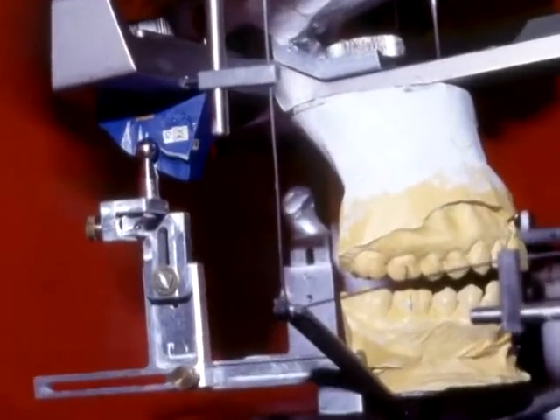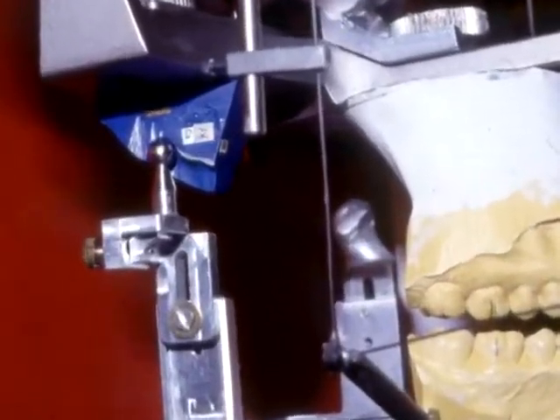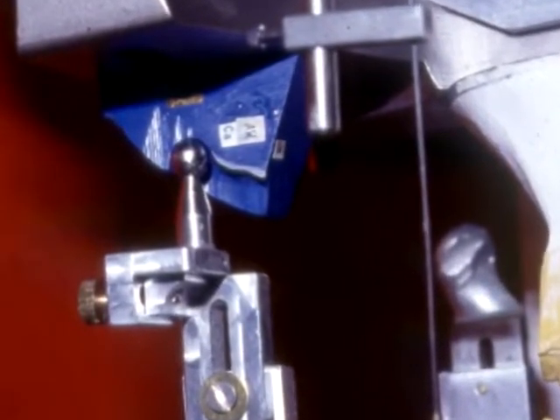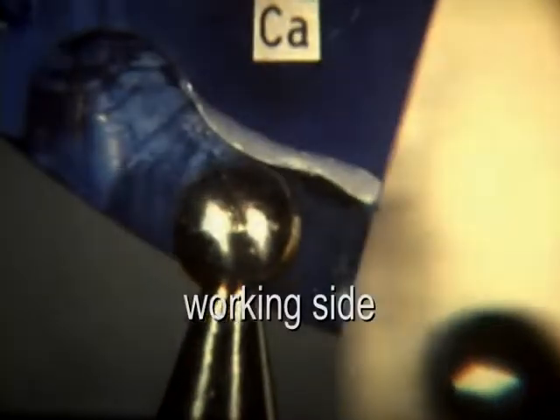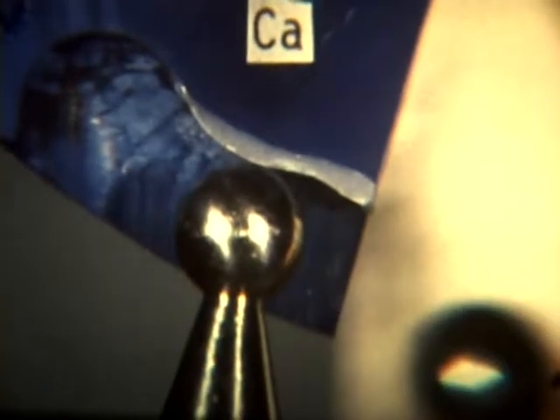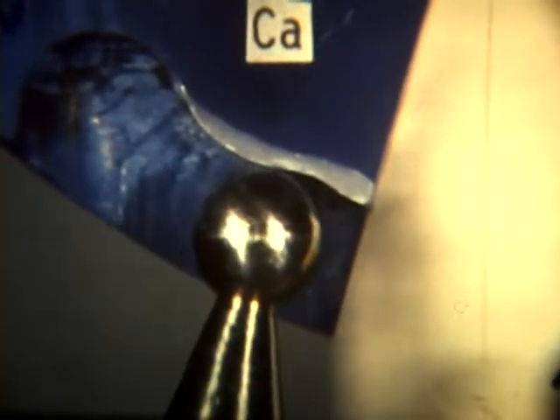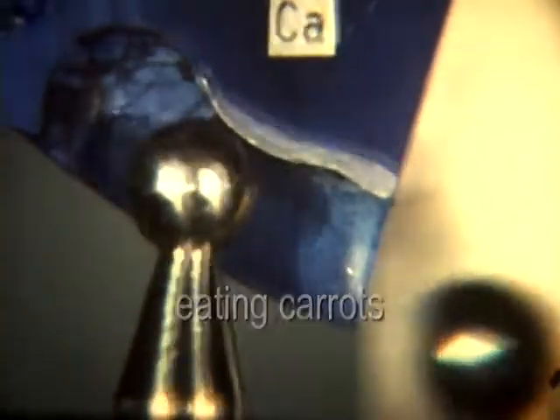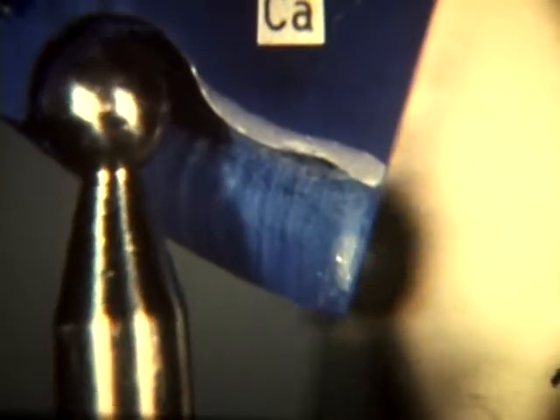The Lee articulator was ideally suited for mounting in the replicator. The analog controls were sectioned, exposing a clear view of the condylar spheres of the articulator, which now could be observed as the mandible moved during chewing. Vertical shaking of the retruded working condyle results from crushing carrots.